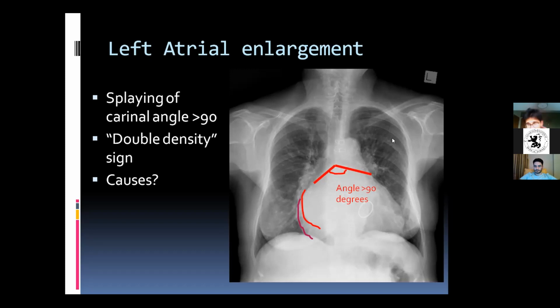And in this case, what do we have over here? We can see it very, very obviously in the X-ray. This person must have significant heart failure, has been having significant heart failure for quite a while. And he was also treated, because you can see a specific feature in this. And what is that? What's that ring over there? Let's see. Yep, it's a prosthetic. Yeah, it's a valve replacement. Exactly. Okay, so in this person, he had a valve replacement, and despite that, he still has a massive left atrial enlargement. Yeah, exactly. Well done.